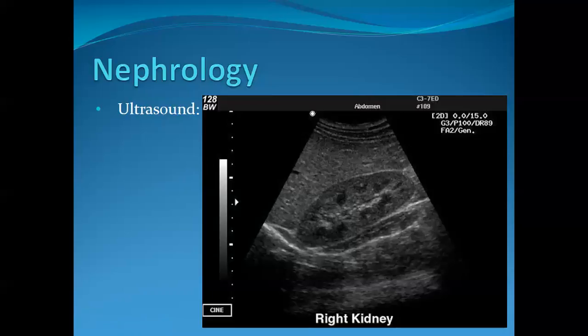And a normal ultrasound. That's the benefits of doing an ultrasound. Primarily is ease of use, no radiation, no contrast. Really good for evaluation, a quick view of the kidney, especially when we're looking for hydronephrosis and potential obstruction. Some of the downsides to ultrasound, you can have some limitations or difficulty in seeing the kidneys, particularly if you have a large patient or there's a lot of bowel gas and things which can obscure the kidneys. So body habitus is a potential limitation given the positioning of the kidneys in their retroperitoneal location and potential to be obscured from body habitus and bowel gas.